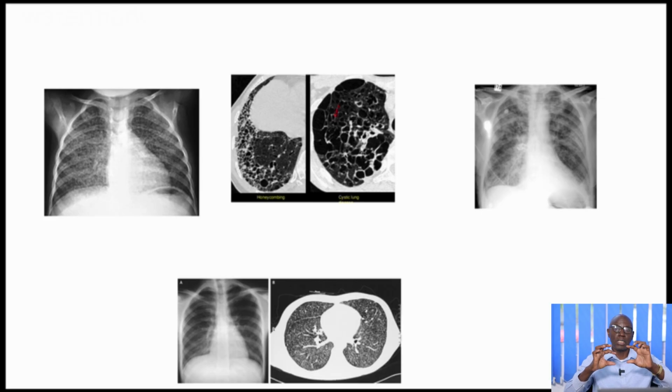If it is distributed in no clear pattern, then that could be a bronchopneumonia. If it is affecting a lobe, then that's a lobar pneumonia. If it is affecting maybe the mid zones, or distributed peripherally, maybe then we can also diagnose COVID, which terrorized us a few years ago. So the distribution of the alveolar pattern gives away the disease process.